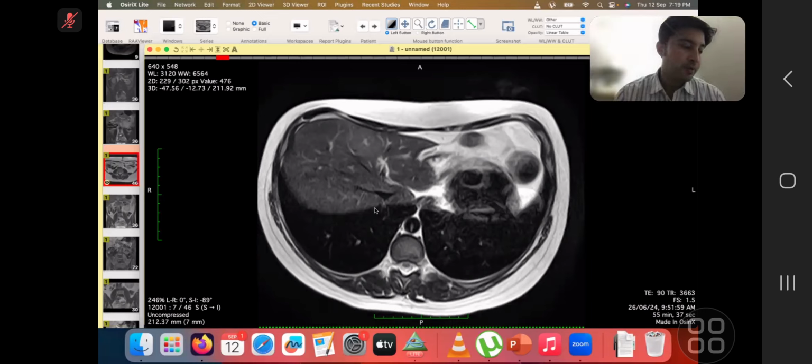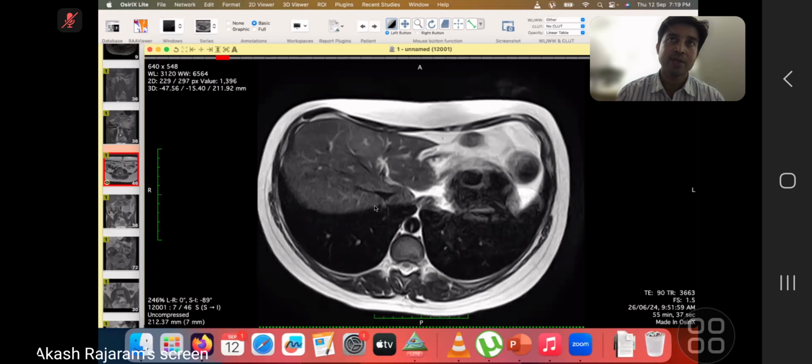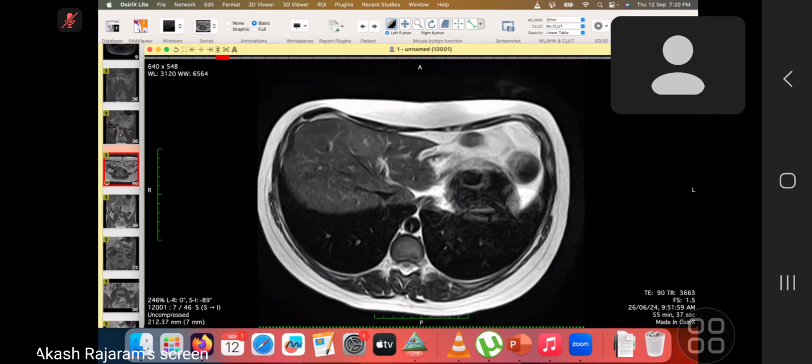Okay, so they want the hepatobiliary team asks you, is there anything they can do to confirm that it is in fact FNH, and if it's not a cancer? Would you call him back for a follow-up, or do you want to do anything else to confirm? I would review the post-contrast images as well to look for any washout seen in the delayed images.